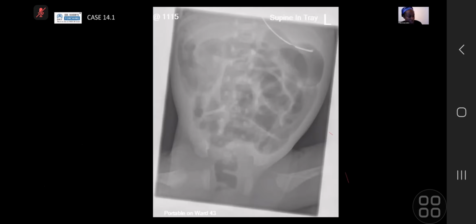So I'm just going to go back to case 1 and say, necrotizing enterocolitis can have very subtle findings on plain film. So I'm showing you a subtle case and then a more florid case, which is the second case. So lines and tubes, you did again, which is, like I said, we have to look at those first because a misplaced line or tube can have its own complications. And then here we can see in the right side of the abdomen that there's some subtle bowel wall thickening, which is a non-specific sign for NEC, necrotizing enterocolitis, but it's important to mention it.